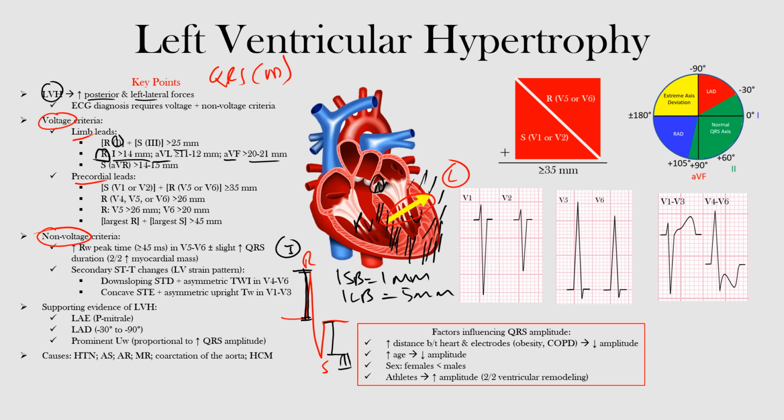Next we have the S wave, this one here, in aVR. So now you're looking at aVR, and you're going to look at the S wave depth, this portion here. In that case, if it's greater than or equal to 14 to 15 millimeters, that would meet that criteria.